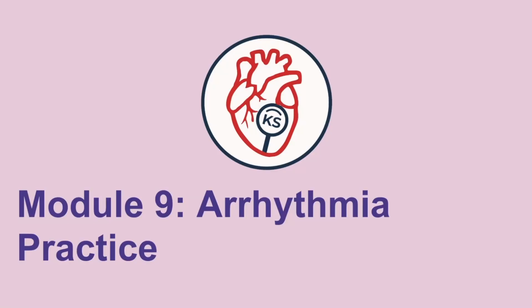Alrighty, welcome to Module 9. This is arrhythmia practice. We're going to run this in the same way, and I want you to use this practice how it benefits you best, okay? So we're going to get a question. You can pause the video if you'd like, and you can answer it yourself, or you can keep it running, and I'll just jump into my explanation of my thought process and what things we might go through, and then move on to the next. But hopefully this will be a good, full explanation of the arrhythmias that we've gone through.